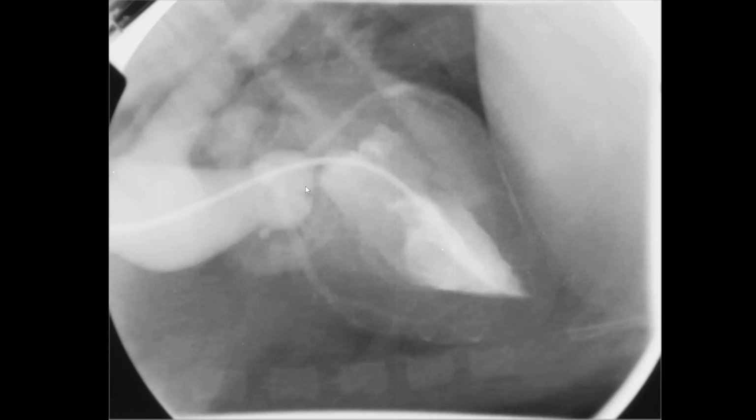Here's a contrast example, again, a contrast where we put a catheter in the left ventricular region, injected the contrast, which shows up white. Here's the aortic arch. Look at how wide and prominent the aortic arch is up in this region here. And this area right in here is super narrowed, okay? As the blood tries to get out of the left ventricle, it goes into this, the sinus of Valsalva, the base of the aortic arch, and we have this super narrowed area right in here. That's the stenosis itself.